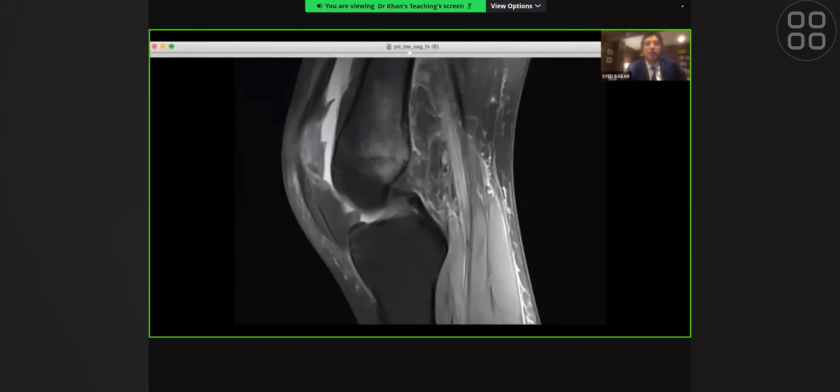Sorry. Oh, that's okay. Okay, give us a summary then, apart from pivot shift. Any other thoughts? I'm just thinking of the normal contusion patterns. I'm a bit confused because there's significant marrow edema, but I've not seen any meniscal injuries or the ACL is intact. The PCL, I believe.